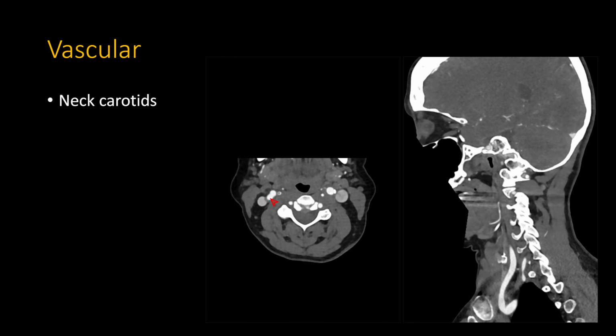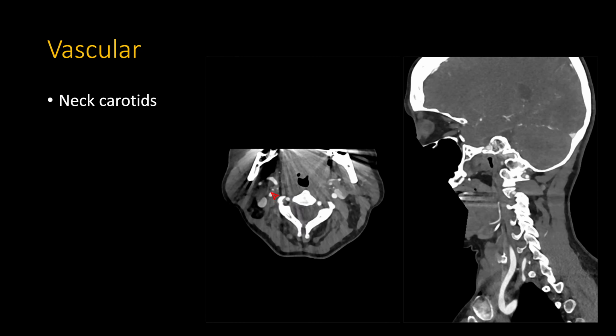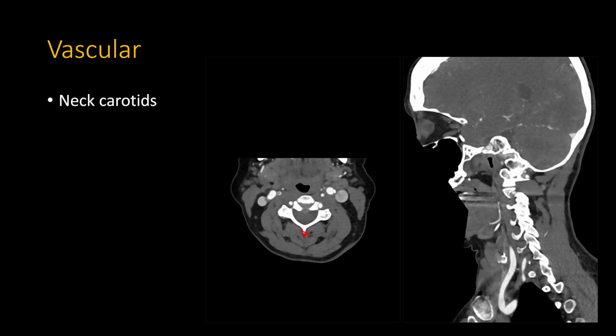And the way you measure that is you see where it's narrowest at around the bulb. You measure that diameter. It's all diameter-based measurements. Then you go up to somewhere distal in the ICA where it looks pretty normal in caliber. You measure that diameter, and then based on those two diameters, you calculate a percentage narrowing. So if your narrowest was 2 millimeters and your normal distal was 5 millimeters, that's a 60% narrowing, in other words, moderate stenosis. Now, if your institution relies on you to give exact NASCET measurements, so you want to give a number, then that's the way to do it.